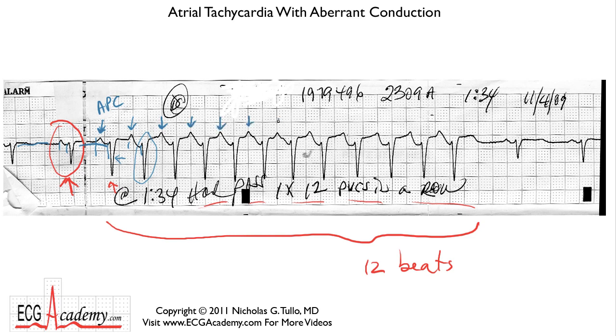And in fact, what I demonstrated in earlier videos is that the relationship between the QRS complex and the following P wave varies. So you can see this one comes a little bit sooner, and then this one comes a little bit later. So it's not part of the T wave. It's separate from the T wave.